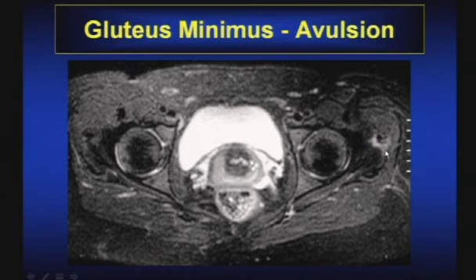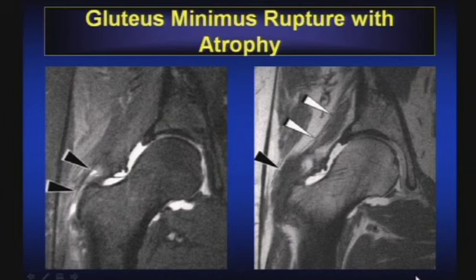So as Don made the point of many ligamentous abnormalities in the wrist, probably having a small osseous component or avulsed fragment, were you to get CT in these patients, it would not surprise me at all to see very small pieces of bone lifted off in the setting of avulsion. Okay, so something to look for both on your CT studies as well as on MR images clearly.